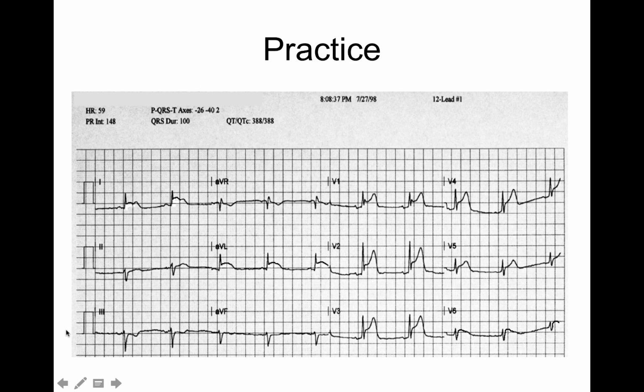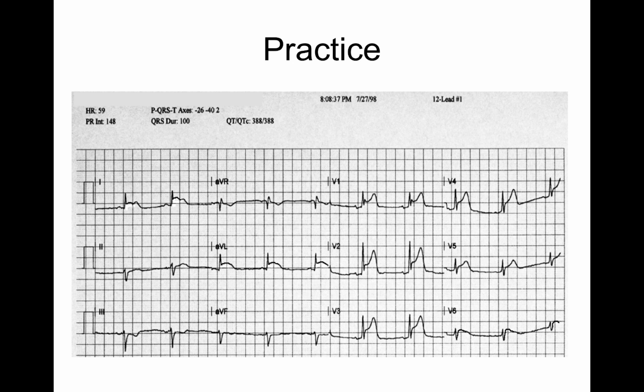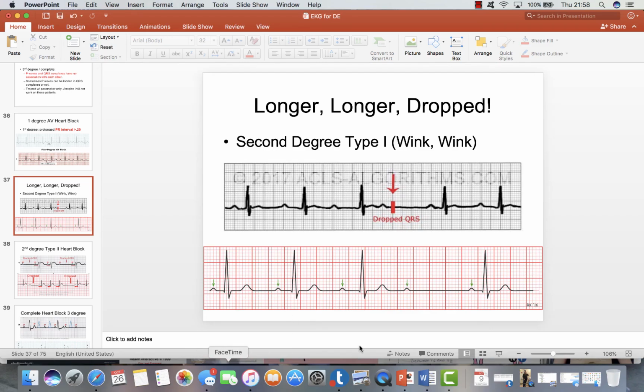Okay. So there's a whole bunch of EKGs that we have with different things. I'm just going to show you that. You can pause the video, try to practice with it. Same thing with this. You can pause the video, practice with it. Practice makes perfect. So that is about it.